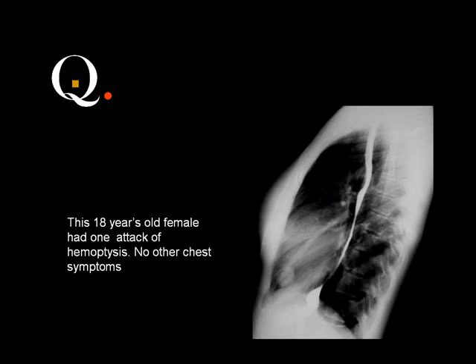Okay. In order to interpret the chest X-ray, all these questions deal with the focal lung lesions. Then you should specify first which category you are dealing with: nodule, mass, patch, cavity. If you are dealing with nodules, you try to select one of 6. If you are dealing with masses, you select one of 3. If you are dealing with patches, you try to select one of 2. If you are dealing with cavities, you try to select one of 8. These are the whole focal lung lesions.